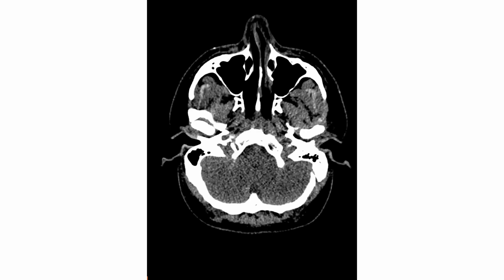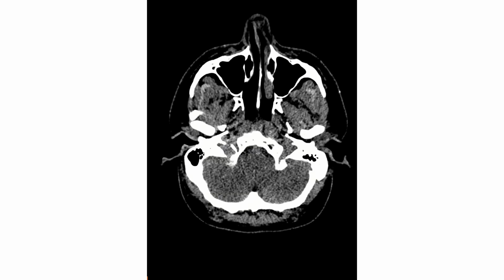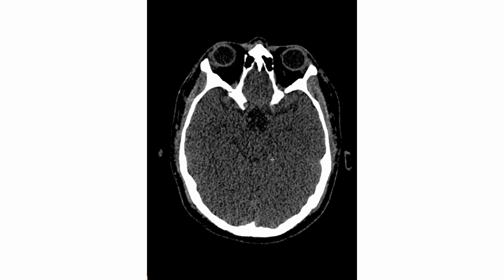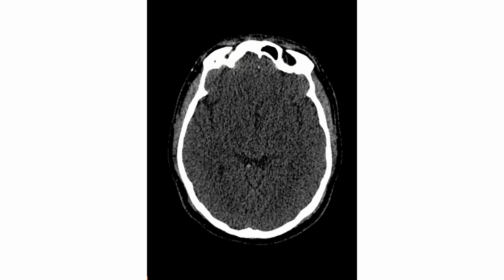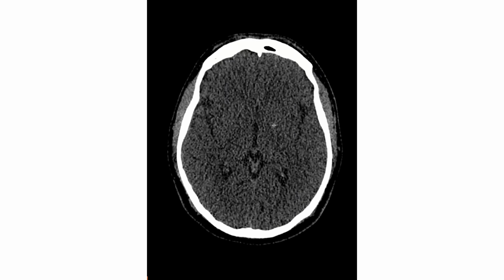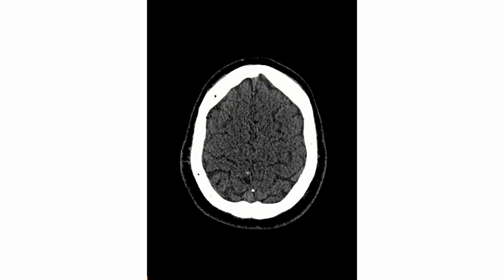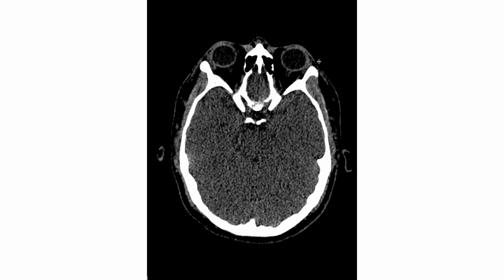So if the patient is old, you might see some intracranial calcification. You see these vertebral arteries, even though this is a non-contrast head CT, but still you see the vascular structure. Sometimes you're going to even be able to recognize some aneurysm in the head CT. So now, when we are here, I always finish my search pattern by looking at the soft tissues.